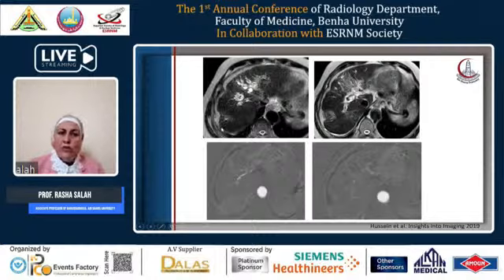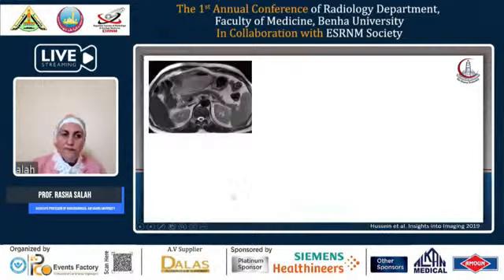Another well treated lesion with no complication over here, with the overlying capsular retraction due to the well treated pattern, and the lesion was not enhancing at all.